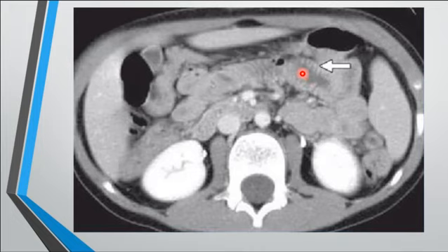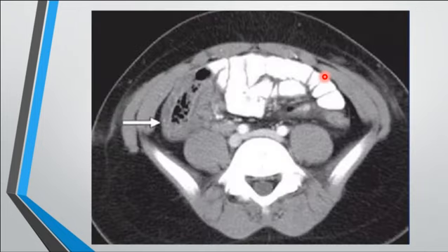Okay, so fluid in the bowel might look like a bowel wall thickening, but it's not real. You should be careful about that. The diameter is normal, there are no signs of intestinal obstruction, no signs of air fluid levels. Of course, the clinical picture also should help guide you with that. There are no clinical signs and symptoms of bowel wall thickening or dilatation. Okay?